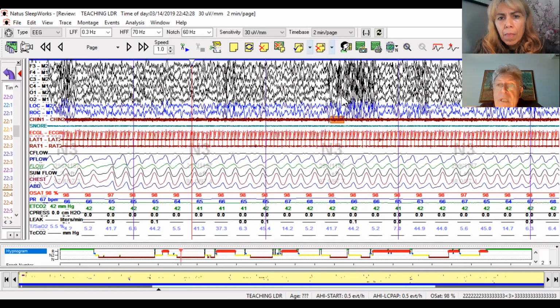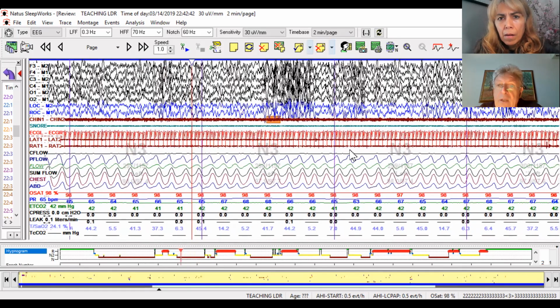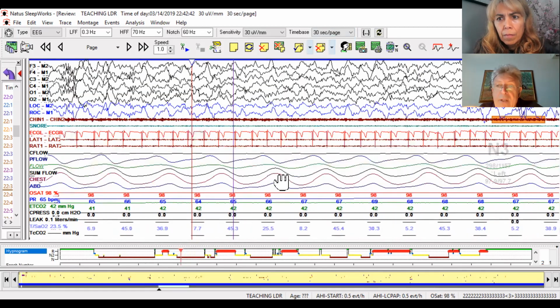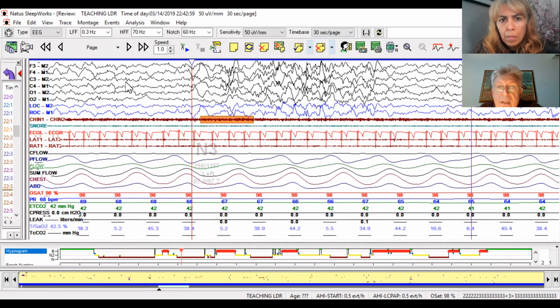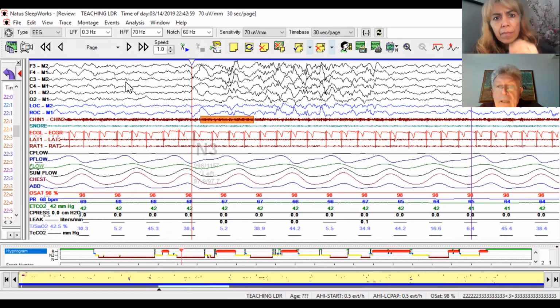Even if it was the EEG alone, but involving more than one channel, and it was like this one, please enlarge it, 30 seconds. Let's see, what are these potentials? Can you amplify a little bit less? Okay, nothing. It is just a burst of high voltage EEG potentials. It is not a movement artifact. It is not an EMG artifact picked by the EEG electrode. So nothing. This is not a movement.